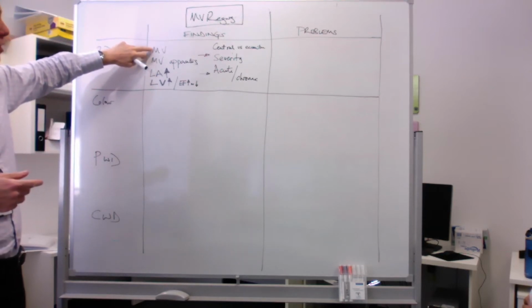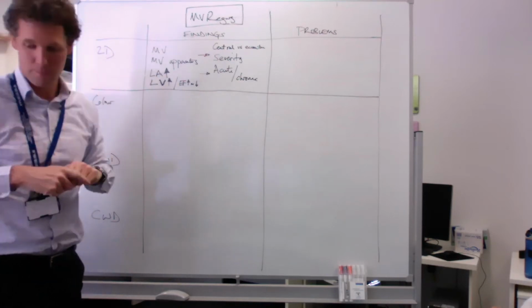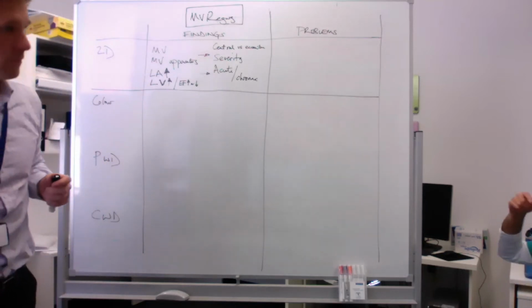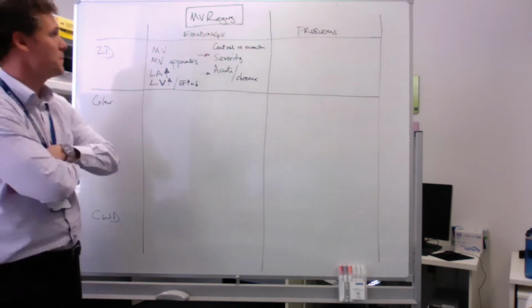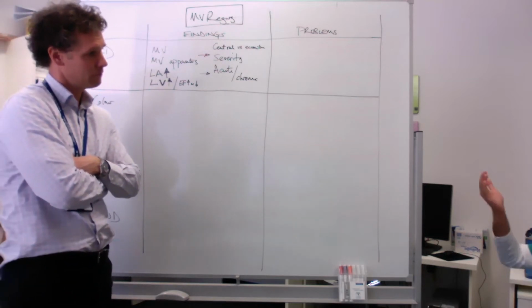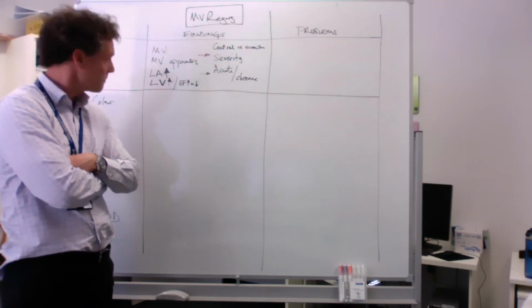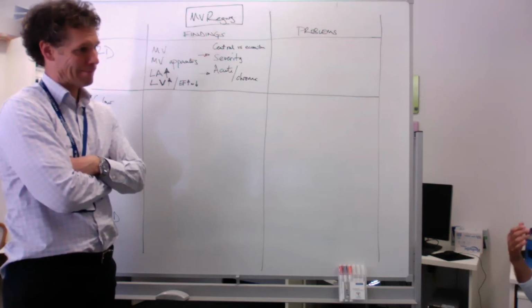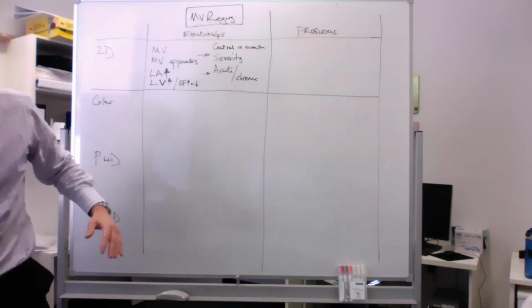So what are we assessing for in the mitral valve? You're saying about prolapse, yeah? So basically, as you said, the mitral valve and mitral valve apparatus. Sometimes it's just a central dilation. You can see the annular diameter. If it's big, then make it a dilation. If it's a prolapse, then we can make out which part of the valve is prolapsing. Nice. And depending on if it's obvious prolapse, we can work out whether it's eccentric MR or central.